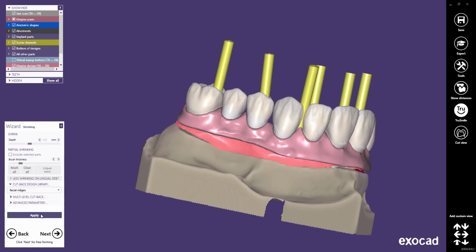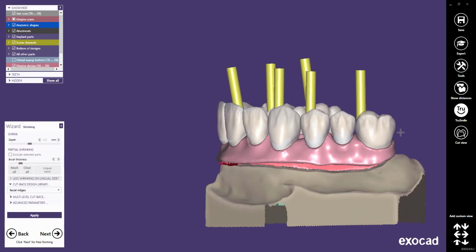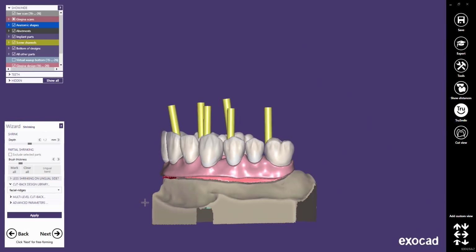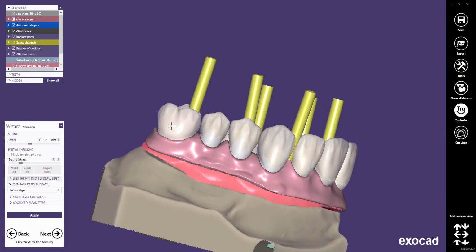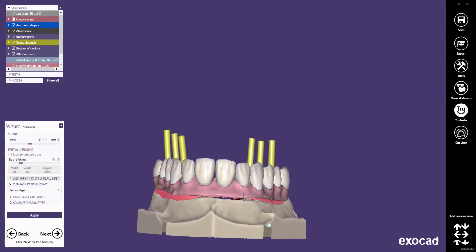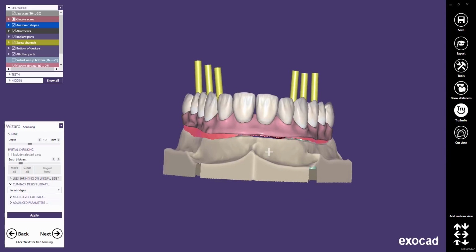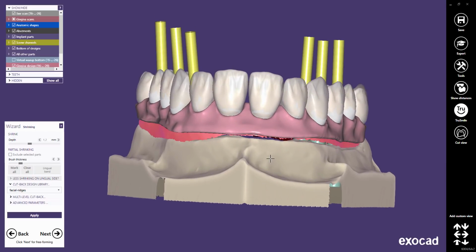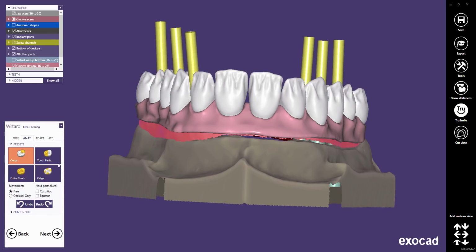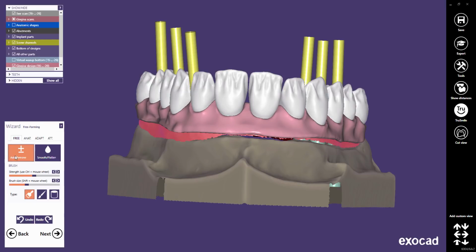Let's compare both teeth again. For tooth 16, the free-forming changes are not applied. Tooth 26 has been cropped correctly. That's why I recommend not to use free-forming on anatomical teeth, or to remove material only. Again, you can use all the known free-forming options.